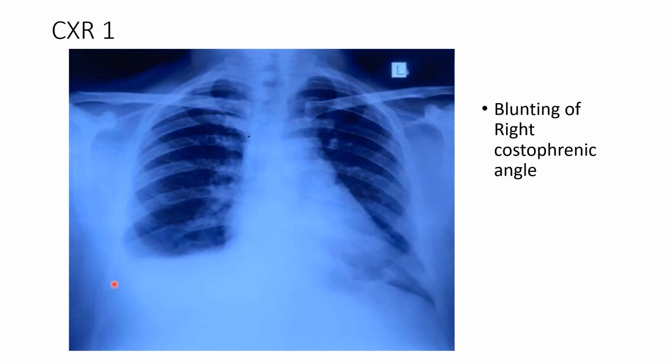I want everyone to focus on this sort of finding, this sort of blunting. This is very important and you should never miss it. In every X-ray that you see, you have to look for the costophrenic angle blunting.